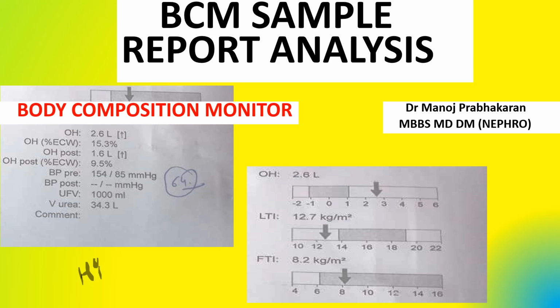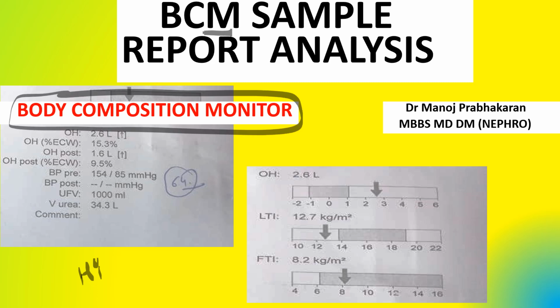The topic for discussion today is the sample report analysis of the BCM, that is body composition monitor. How to interpret this and what are the clinical uses. Body composition monitor sample report analysis.